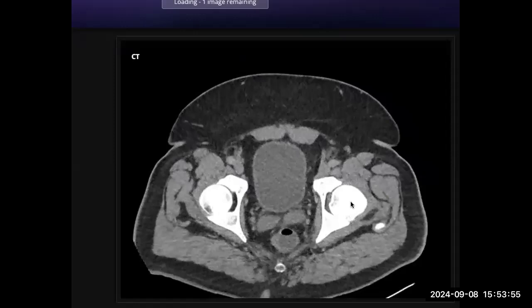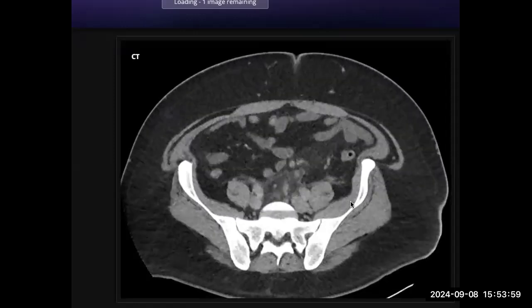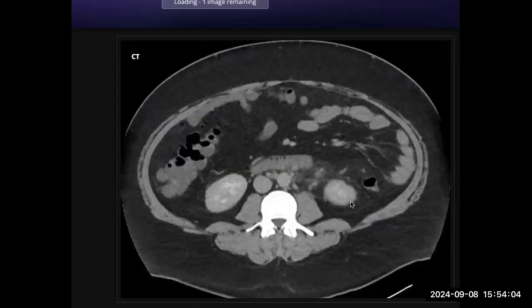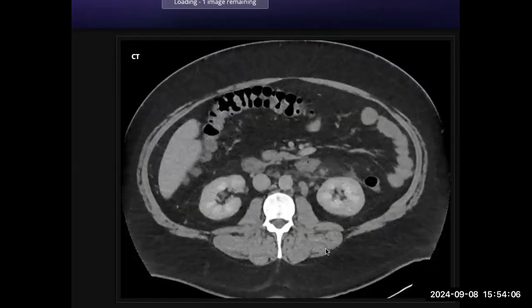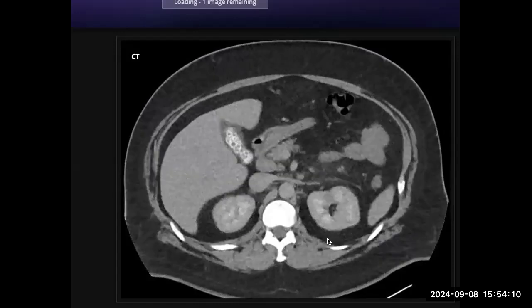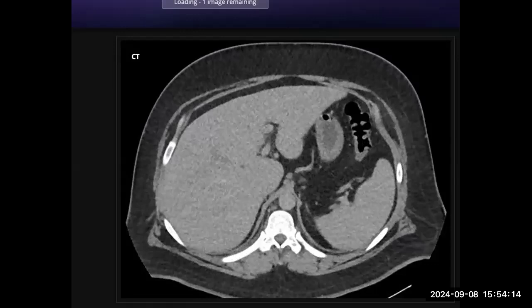I think this is a case of acute diverticulitis, and this is an emergency. I would like to inform these findings to the referring doctor immediately, and also I would like to see it in the lung window to see if there is any pneumoperitoneum or focal perforation.